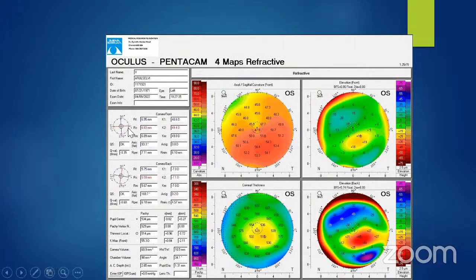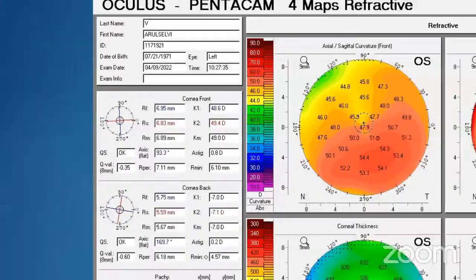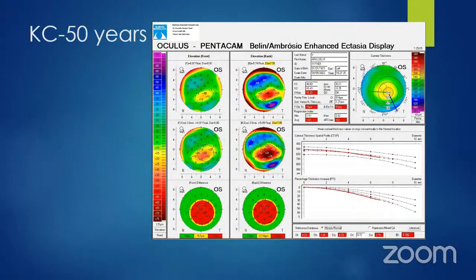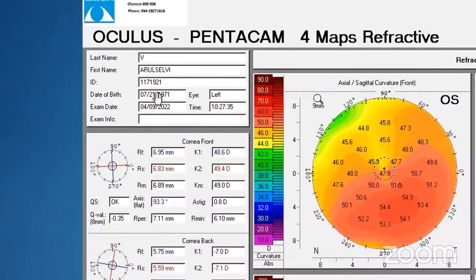I had told you, start from looking at what is the date of birth, what is the year. "50-year-old patient this is," okay? That's the reason I put it up. Before you think of doing something, look at the date of birth. This patient is pretty stable, okay?